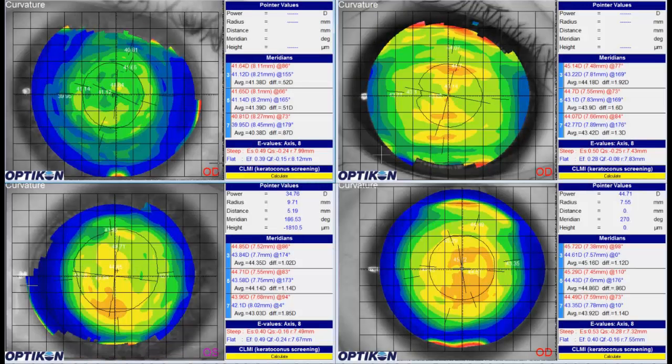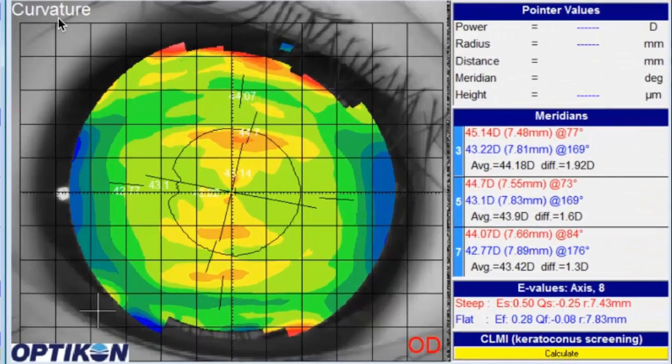On the screen right now are 4 single eye captures from 4 different patients, and each has at least one element that could be a potential challenge to a smooth treatment regimen, but really none of these patients have any outstanding topographical anomalies that automatically disqualify them from OrthoK. It's the subtleties that we'll encounter a little bit more often than the glaring problems, and I'll try to point out some of these more common ones that I see, starting with the map on the upper right.